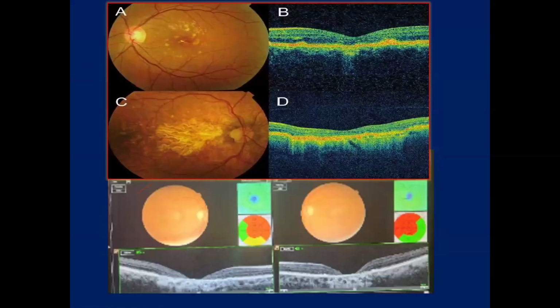You can see here, patients present to you with a bare macula. There is nothing here. You cannot see retinal pigment epithelium in the background. On OCT, it's already thin. This is one of my patients recently. If you see the center of the fovea, it's quite white. And here you will not appreciate any neurosensory retina. Almost the retina comes fixed onto the retinal pigment, a completely atrophied retina with thickness almost less than 50, 60, and the patient is having poor vision. Such a patient doesn't benefit from any treatment. You might give them some supplements. Otherwise, such a case will not benefit from injection or other treatment.